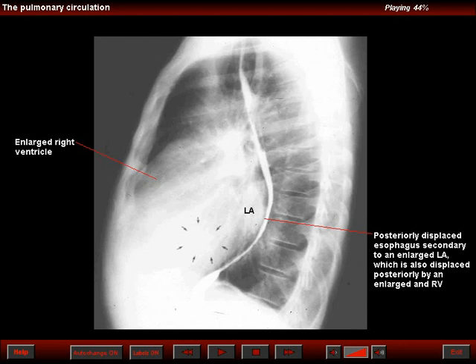What is of interest in this case is to note calcification that does not project in the center, but below, behind, and to the left of the position of the aortic valve. In other words, if we had a frontal view of the chest, we would see that this calcification is to the left of the midline. This calcification is typical of mitral valvular calcification.